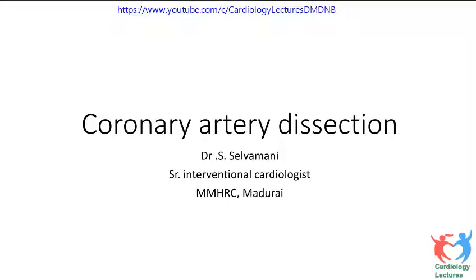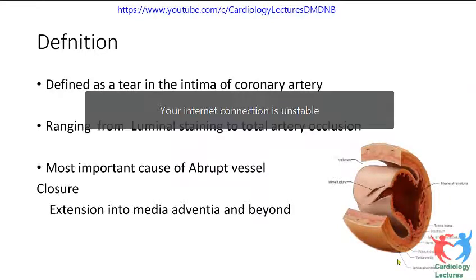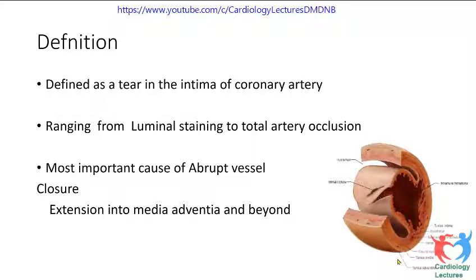With all this, I think we'll go to the topic today. Coronary artery dissection and classification. I'll show you some cases, and in between I'll tell you how to treat such cases, because there is no real literature recommendation for dissection per se, or there are not many guidelines there.